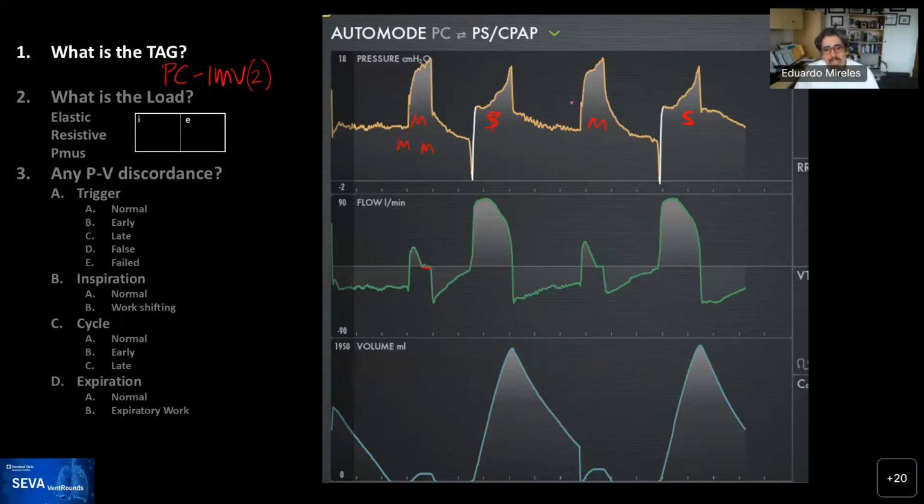So here you still see the two types, but if the patient continues to breathe at a higher rate than the algorithm wants, you will only see spontaneous breaths occurring. So this is type 2. And you could have very low minute ventilation or very high respiratory rate. The mandatory breaths are not going to appear as long as you are above the frequency.